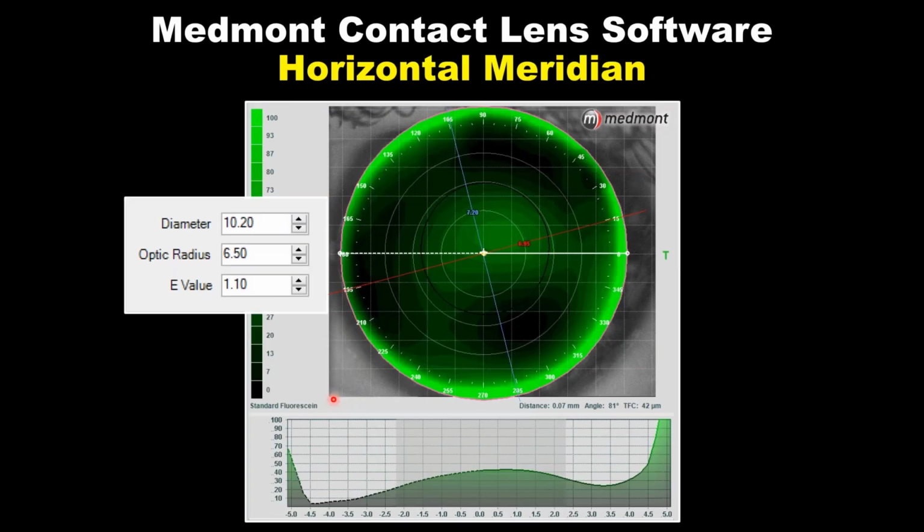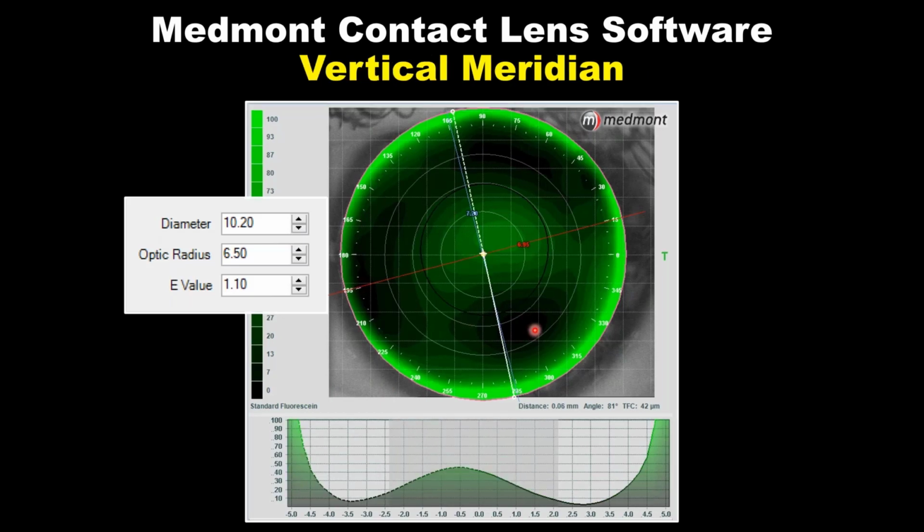Now let's put on a corneal GP in the contact lens software. Let's get a sense of if a corneal GP will look appropriate. Does it appear that it has hope of being successful? Are we confident that a corneal GP might work? And here we're seeing a relatively acceptable pattern. We have apical clearance. We're able to clear over top of the cone. We've got what appears to be 3 pivot points or 3 landing points for the contact lens.